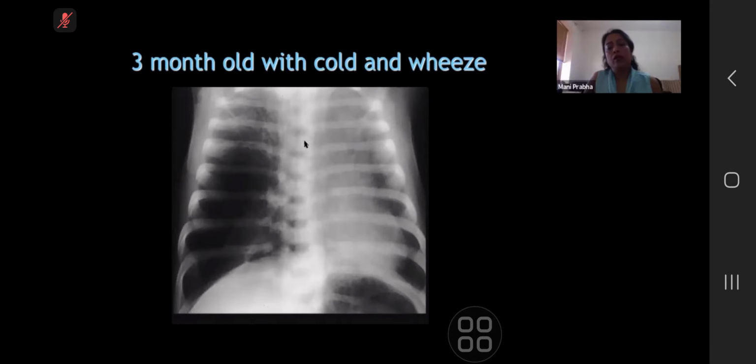Okay. So in this X-ray, we can see hyperlucency in the right middle and lower zones, and shift of the mediastinum to the left side. So something is pushing the mediastinum to the left side, isn't it? Yes, and there is also added lucency. There is no internal septation or opacification in this, and there is probably compression of the adjacent lung parenchyma.